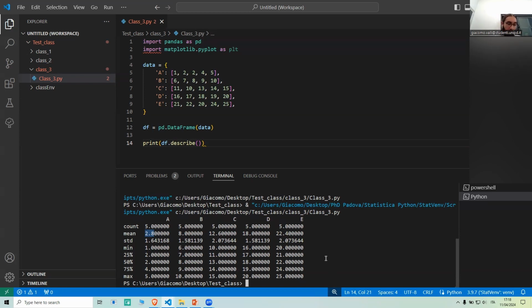This is why we created a table with all numerical objects, because otherwise the functions that we are using from now on will provide slightly different results. Although the tables can work with any type of content, with strings, for example.